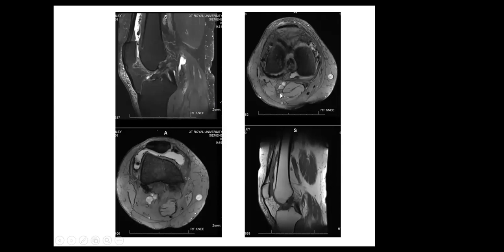What is the usefulness of gradient echo for the knee or any joint? Gradient could be for calcification, or hemorrhage. Yeah, okay. So what we're seeing in this patient is diffuse nodular synovial thickening. Okay, you can see it here. I think you said there's nodular, or you said there is synovial abnormal foci. So these are the foci here, and you can see even here, and here, there, and here.